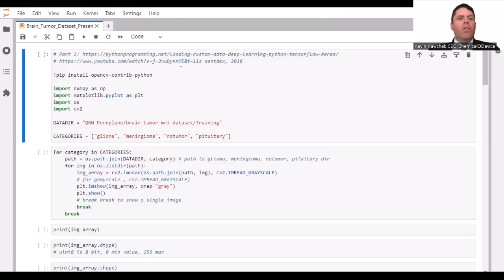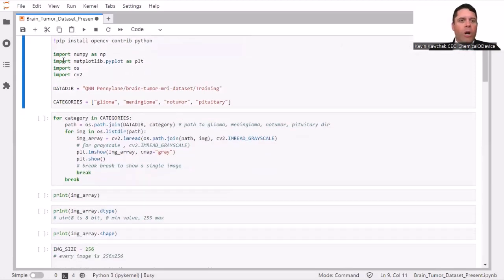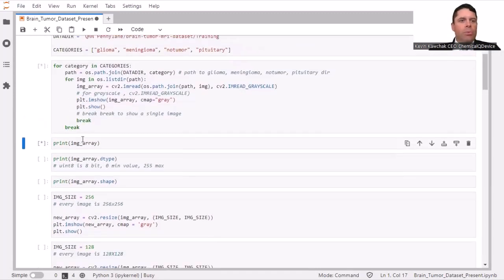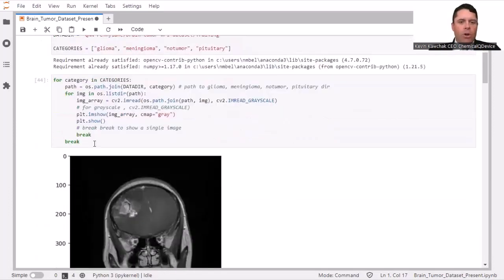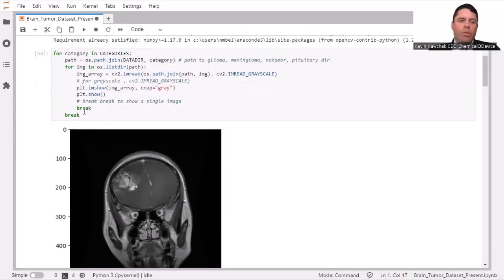So this first demo is basically inserting the brain data set that I've been looking for, and it's local on the computer. So I'm running the code right now. It just takes a little bit, and it'll eventually display an example of an image as it goes through these stars. Oh, here we go. Okay. So in this specific one, this is a database of over 5,000 images, and what it's leading up to is a classical convolutional neural net.